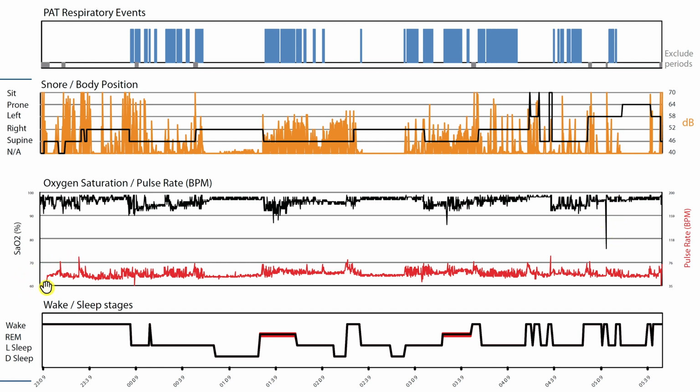And then on the bottom here, we have the pulse rate. You gotta change the units though, right? So the units for the oxygen saturation are over here, but the units for the pulse rate are over here in beats per minute. So at the bottom, there's 35 beats per minute, and at the top, there's 200 beats per minute. And if you're kind of confused looking at this graphic, a good mental thing you can do is just, when you're looking at one, you just obliterate the other.